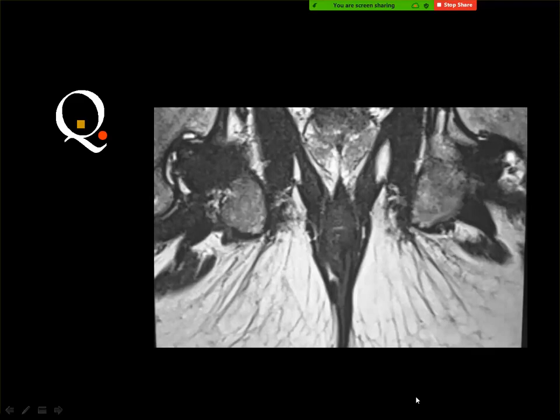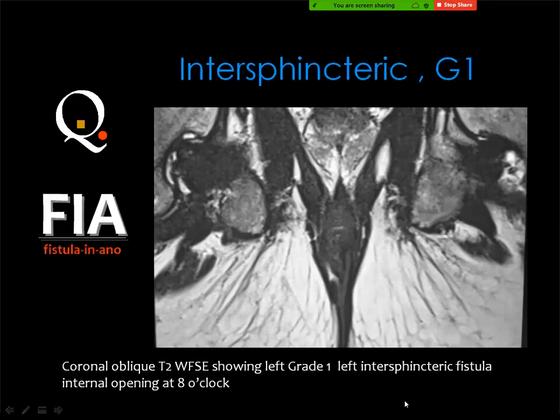Intersphincteric, grade 1, without any branch. Very good.